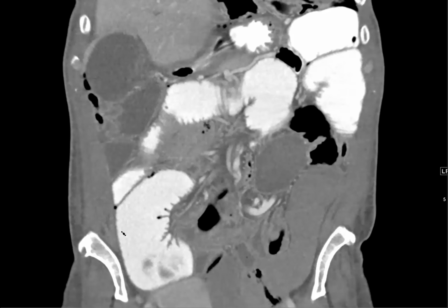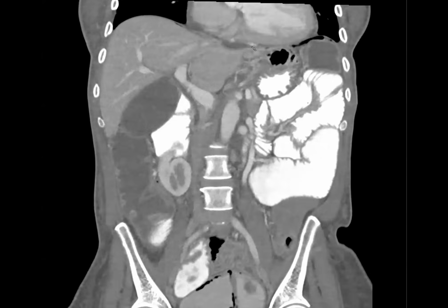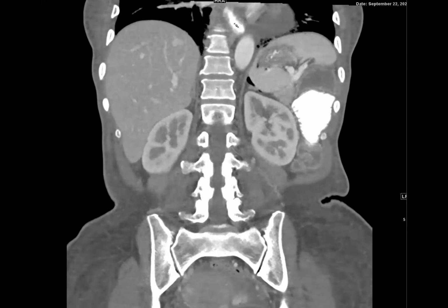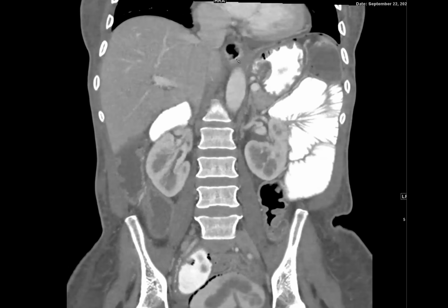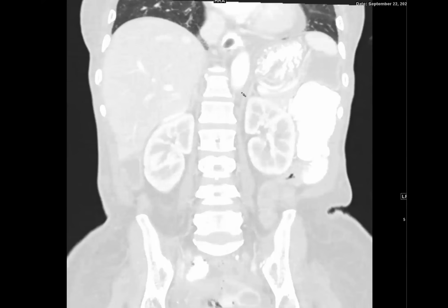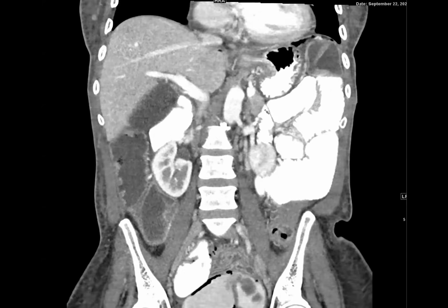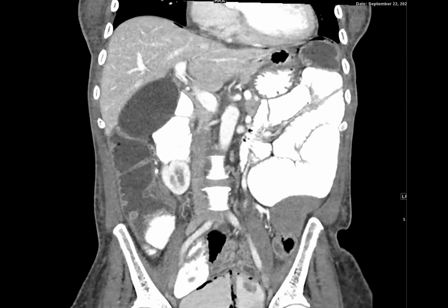So this is like the hidebound bowel. You get dilated bowel, but you maintain the folds. And then they also get patulousness of their esophagus because of the connective collagen deposition in the wall of the esophagus, so it becomes patulous. And they also have a little bit of fibrosis at their lung bases. So this is scleroderma. And the question is, are you concerned about this pneumatosis?